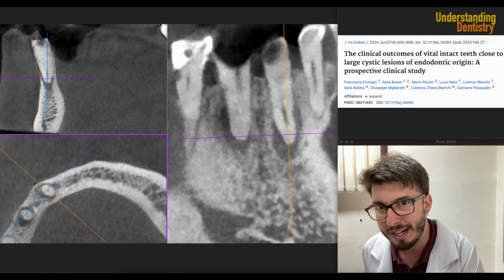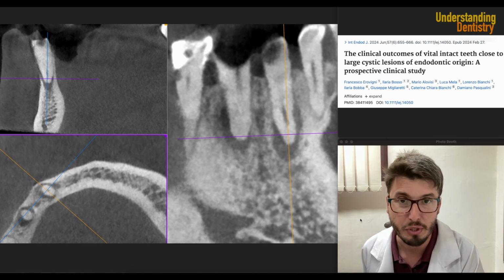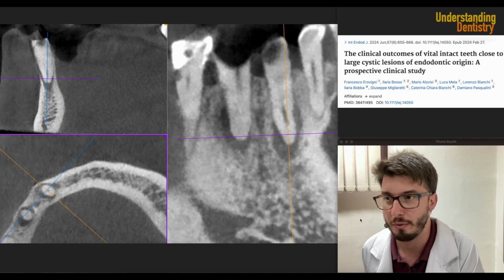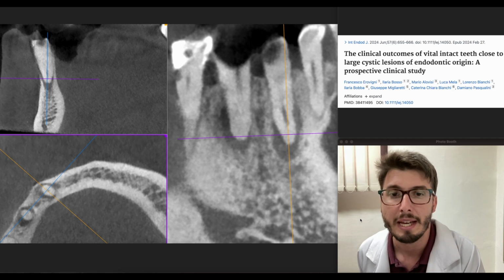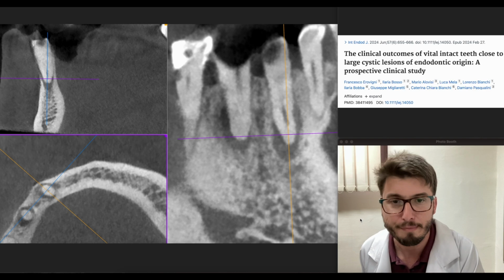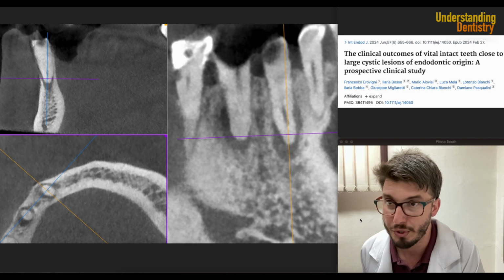Of course, here you are seeing that the teeth are fractured. It would be hard to rehabilitate those teeth, but you could, depending on the age of the patient and on economic questions as well. You might want to be conservative and try to do the endo, post, and crown, depending on the situation. But of course, the prognosis here is not favorable for those two teeth.